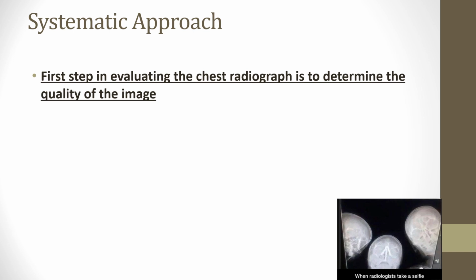The first real step, I'll call it step 1A, is to make sure you have the right patient and the right birthday. Does the patient's name and birthday match up to what your patient's is? There are so many John Smiths out there, so you just need to make sure you've got the right person.